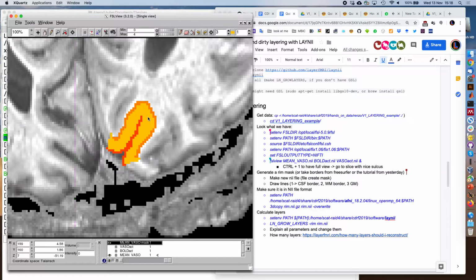Okay. You have the whole region of interest. Move it just like that. That's the way. And now maybe draw it. You see this one? No, this one. But then it has to be continuous, then you can fill it up later. Okay. Much better. So I will quickly erase.